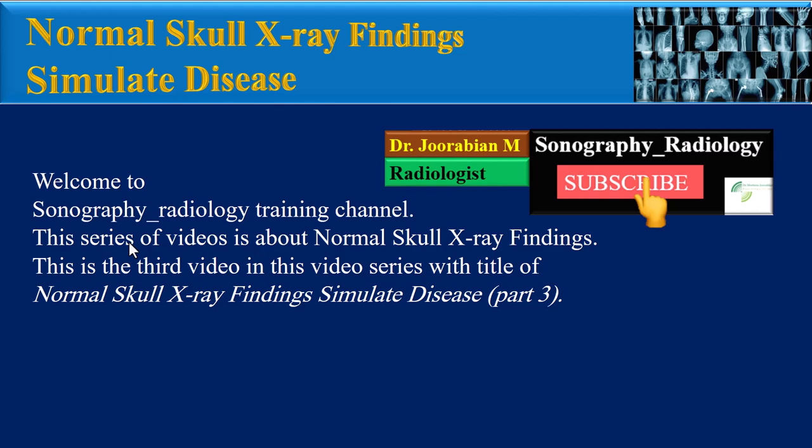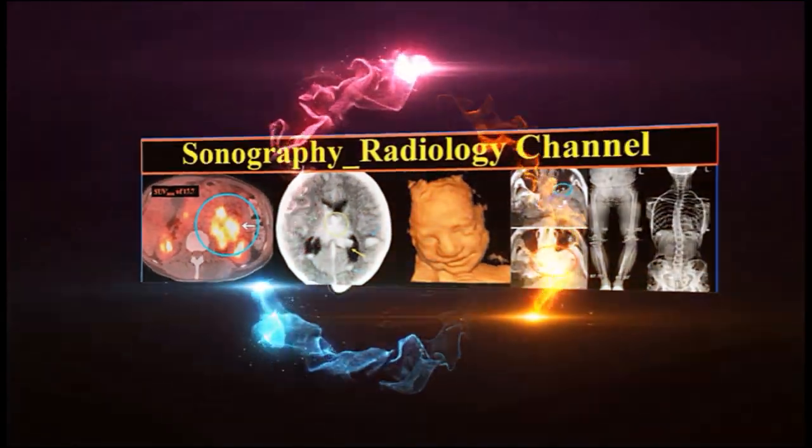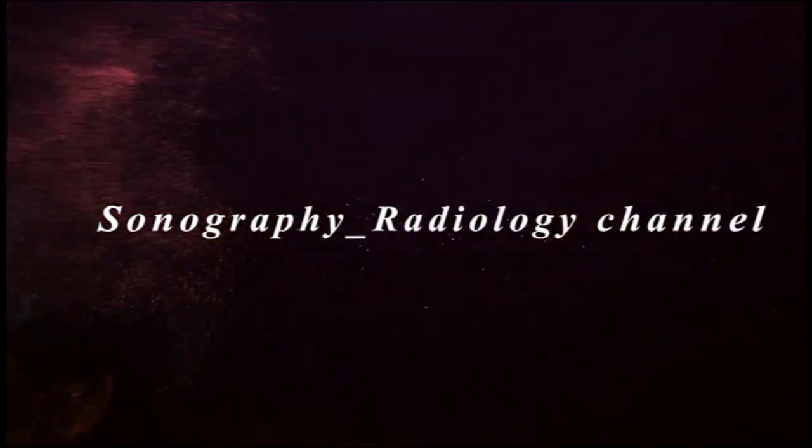This series of videos is about normal skull X-ray findings. This is the third video in this series, titled Normal Skull X-ray Findings Simulate Disease Part 3. Like previous videos, we will review a few cases together.